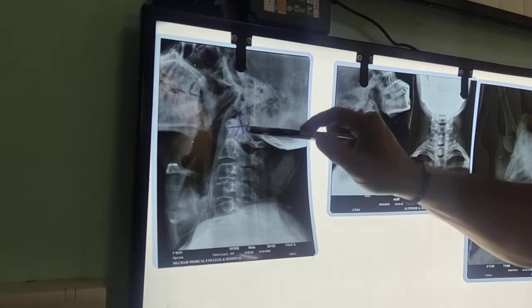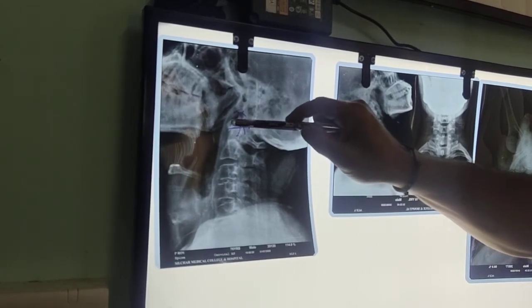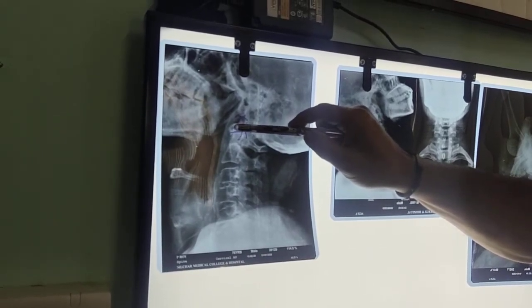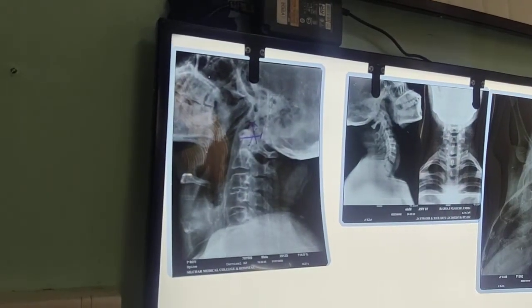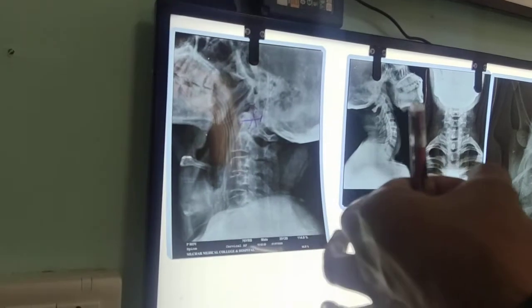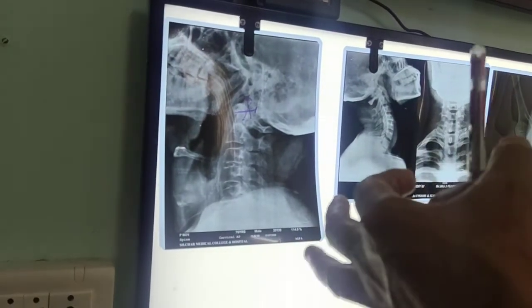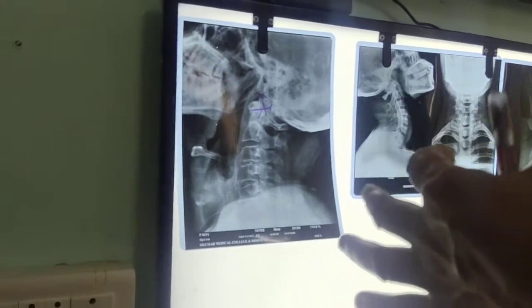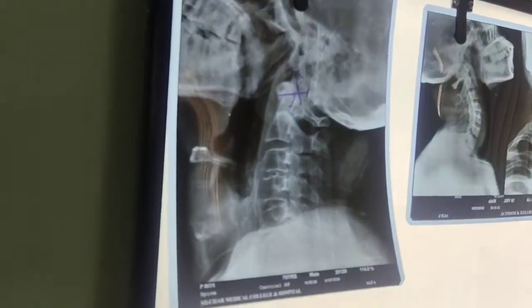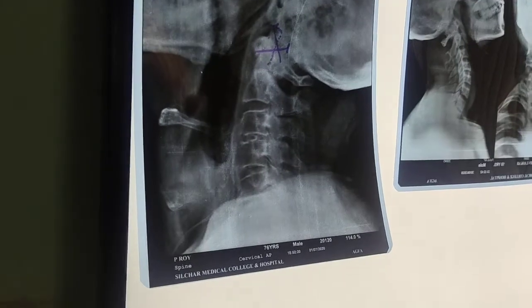This is the odontoid process. This is actually your C1 here. There is no body but a ring. You have the ring here. Your odontoid process is here. Anteriorly you have this C1. There is no body as such, but the anterior arch of the C1 vertebra. Okay?